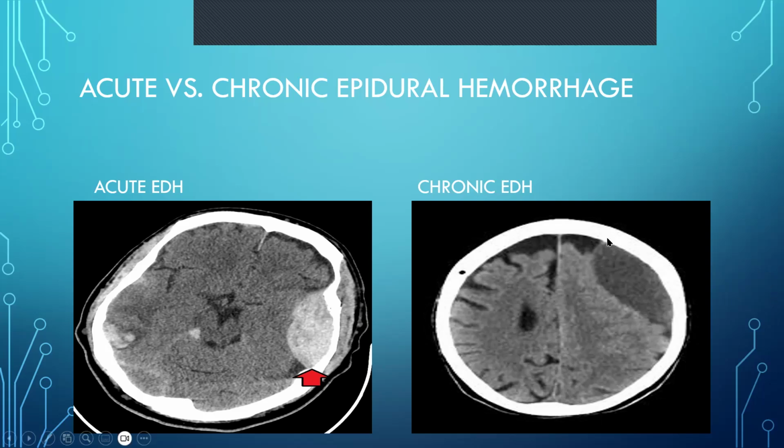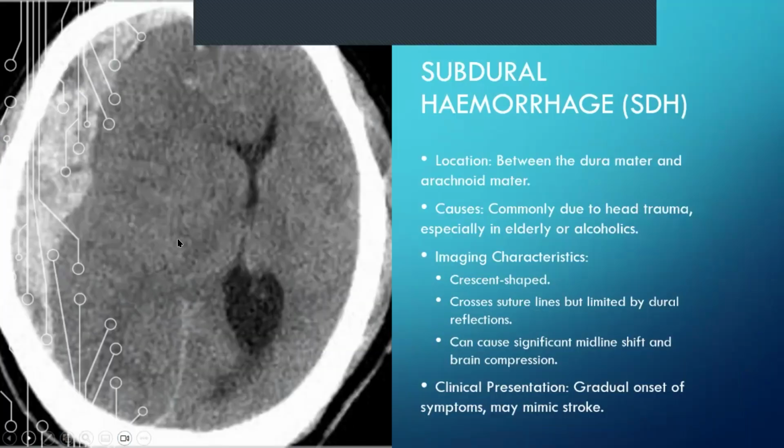And you can see the chronic epidural also has that classic shape. You know, it has a biconvex or concave shape. If you're looking at it from this point of view, you can see again, it generally has a large middle, and then, as it's been pushing the dura away, it becomes smaller and tapers away towards the edges. So that's how you can see what's going on. I hope that makes sense, and I hope you guys understand that part of it. And like I say, if you want to go back, more than welcome. Just stop me in the chat or on the audio, and then we can take it further.